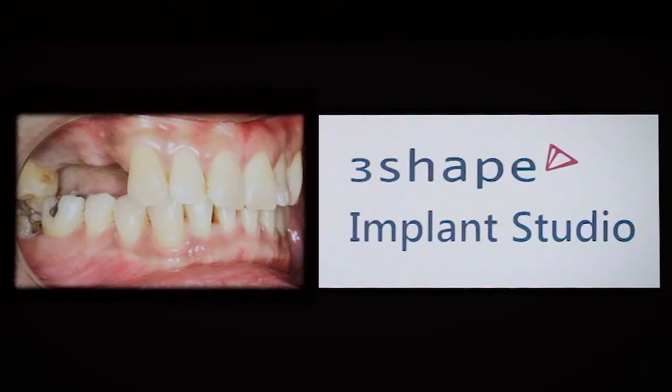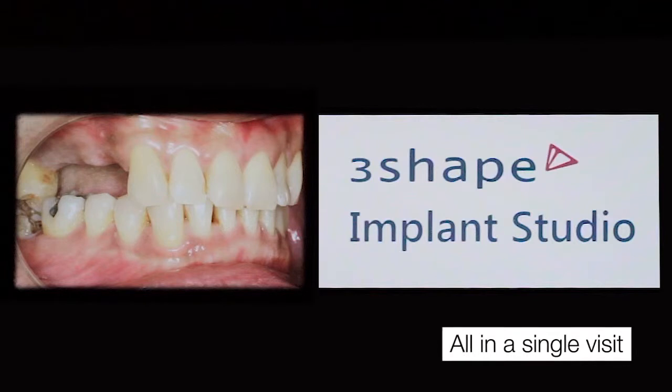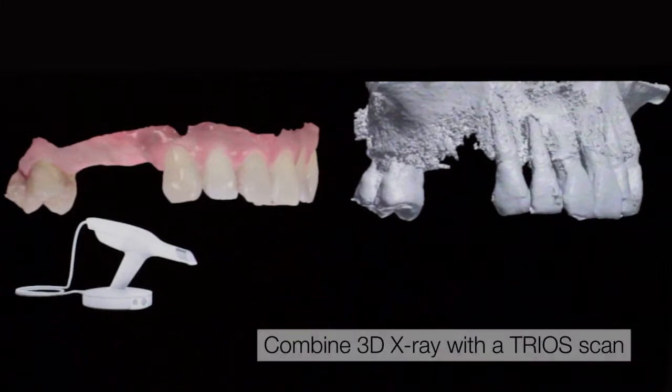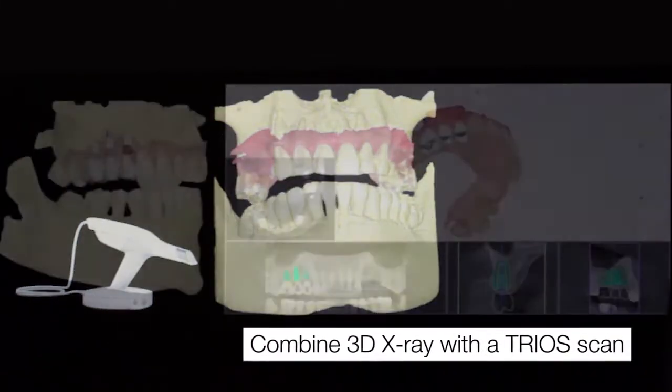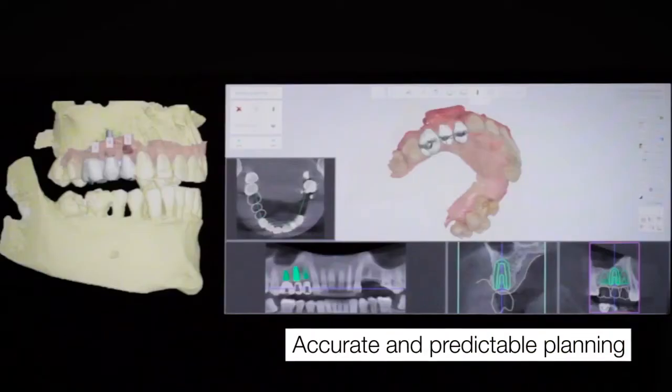One of our favorite cases using Implant Studio was a case where we were able to provide our patient a very predictable, safe, and efficient form of implant treatment, all done the same day. We're able to take the patient's preoperative scan as well as the patient's 3D X-ray and very efficiently combine that together within Implant Studio. It allows us to make sure that we can take the different data sets and accurately combine them to make sure that the virtual implant planning is very accurate as well as very predictable.